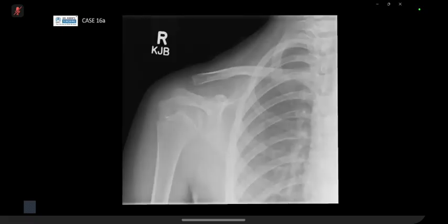Yeah, well done. So going back to the first one, you can see that there's actually expansion of the medial clavicle. You're right, there is no significant bony destruction, but what you have here is periosteal reaction along the medial edge, just underneath here, and possibly along the top. This is smooth periosteal reaction, suggesting a fairly chronic process. Because like what Dr. Kapoor said earlier, when you have a more aggressive periosteal reaction, the bone has not had time to lay down, so you get partially laid down bone, and then with destruction, you get a Codman's triangle. Can you imagine the periosteum is trying to lay down bone, but part of it is being eaten away by whatever destructive process is there.